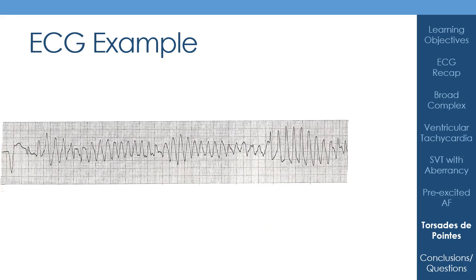Okay, so I've got an ECG example for you here. This is only a single strip, and so I apologize for that, and I won't expect you to go through the whole thing, but just take a couple of seconds and try and pick out the bits that look most bizarre to you or make you think.